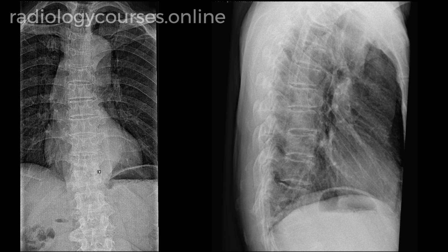So based on these appearances, the chief diagnosis would be discitis, despite the clinical history of carcinoma of the urinary bladder. So what do we do next? We need to do MRI of the whole spine, including sagittal STIR sequence and, if necessary, post-contrast fat-sat T1 sequences to further evaluate this abnormality and confirm the diagnosis of discitis, which was done later.